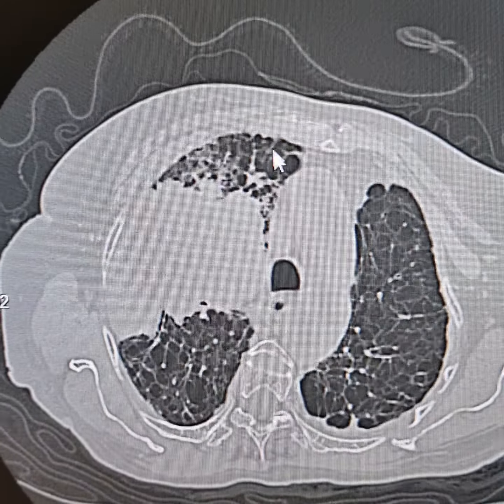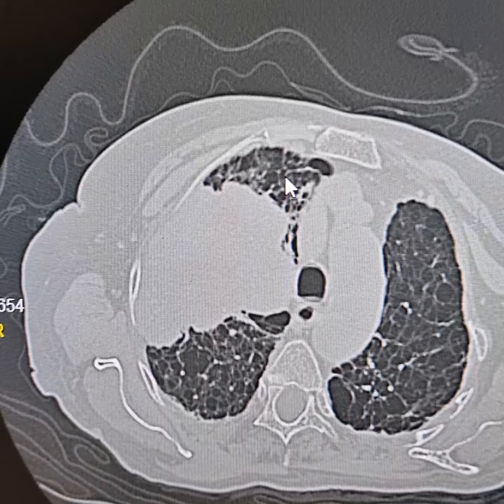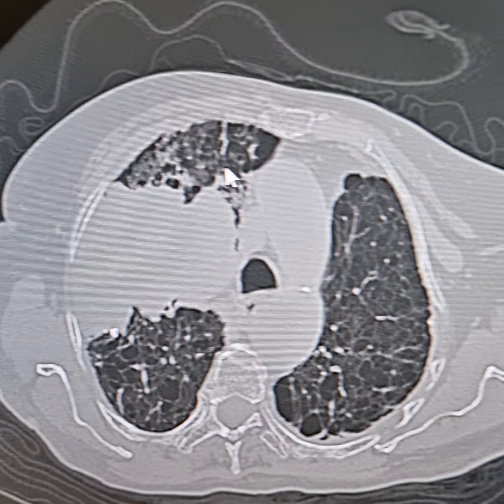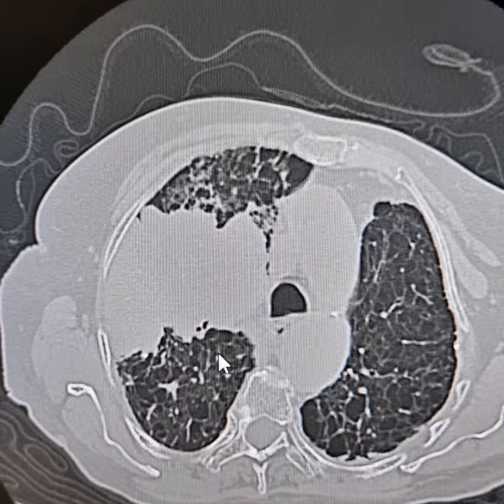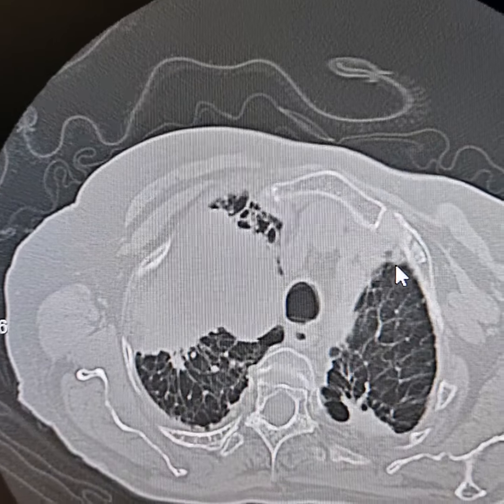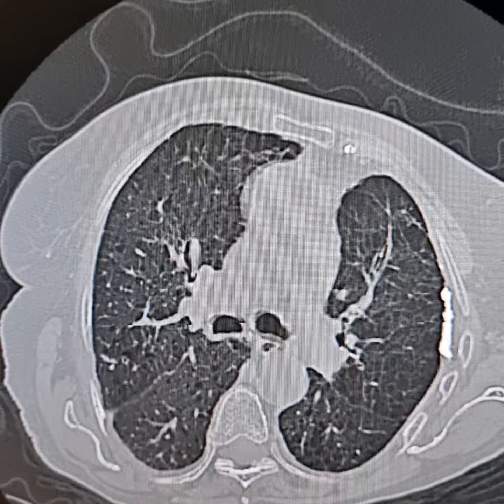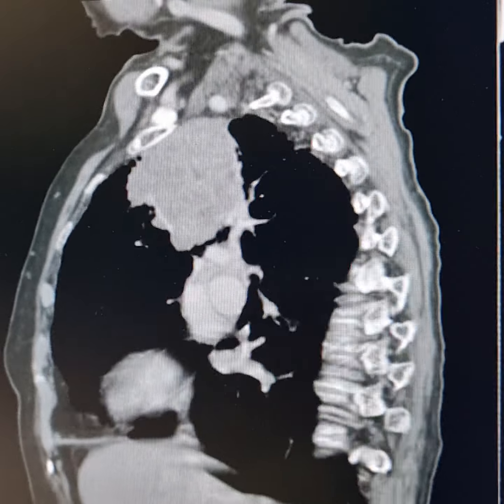Now please observe these linear irregular thickenings of the interlobular septa in the right upper lobe. These are suggestive of lymphangitis carcinomatosis. These are irregular nodular thickenings of the interlobular septa in the right upper lobe. These are suggestive of lymphangitis carcinomatosis. No pulmonary metastases were present.